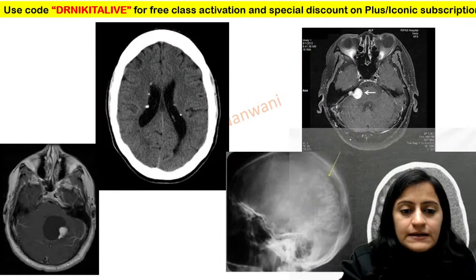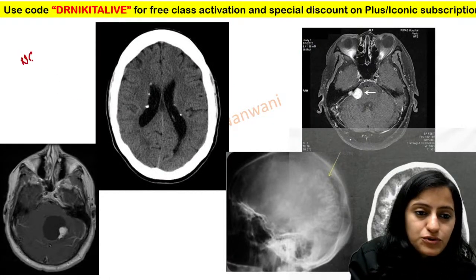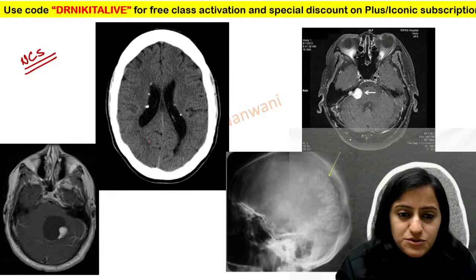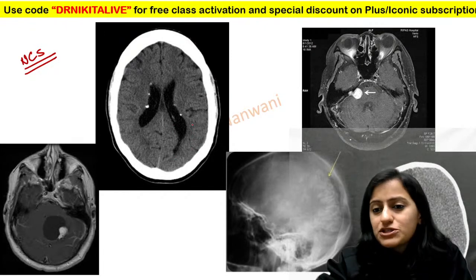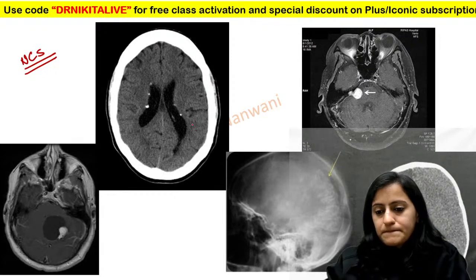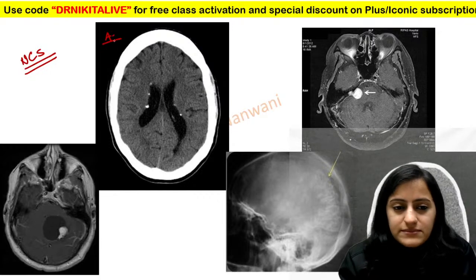All right. Let's see these images. These are very, very important. Basically your neurocutaneous syndromes. First one, very, very important. What image do you think this is? What is the first image showing?